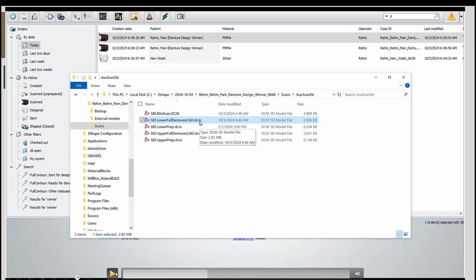So what we want to do is swap out this file for a file that is aligned to our previous design. Now if we just pull that directly from our manufacturing drive, it's not going to be aligned, and nothing's going to work because they're not going to be lined up. Because remember, in our manufacturing drive, they're no longer aligned to our design, they're aligned for manufacturing.